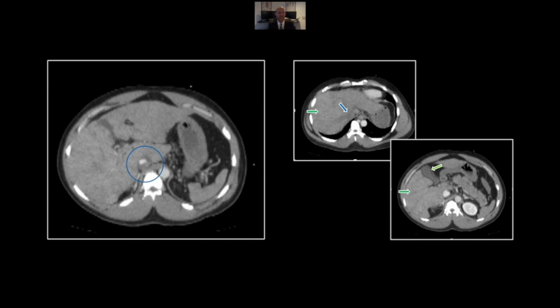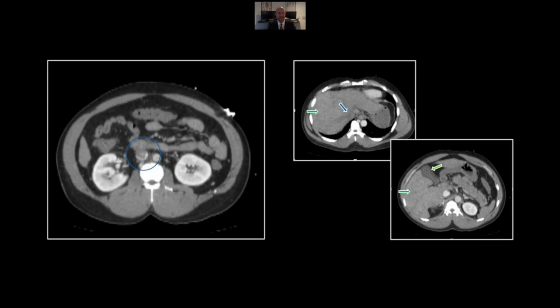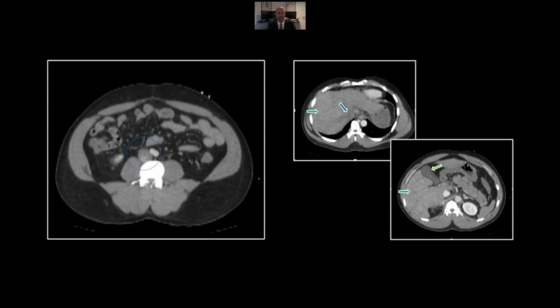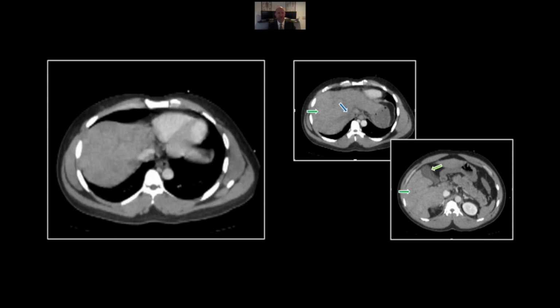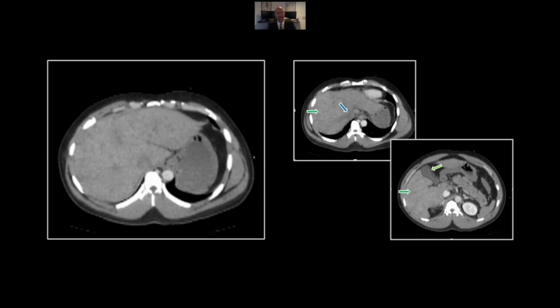Appreciate again the variation in hepatic parenchymal enhancement and that gallbladder wall thickening. Even get the sense of webs and perhaps some clot organization in that infrahepatic IVC.